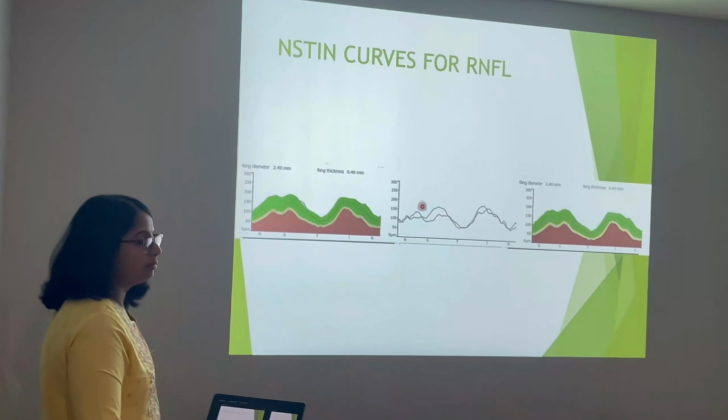If the vitreous floater is outside that circle, the RNFL values are normal. When the floater entered this circle, that area showed RNFL thinning. And when the eye moved again, the vitreous floater changed position to 6 o'clock, and the RNFL thinning changed area. So we always have to check the fundus image for any vitreous floaters in the measurement area.